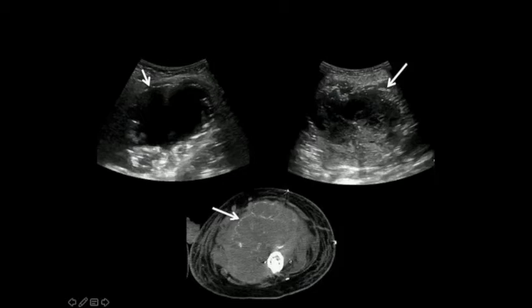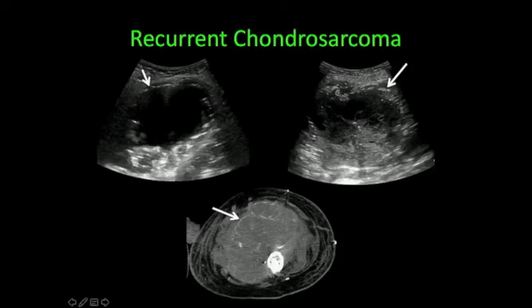So this is taking up the thigh musculature, but this was in a patient who'd had a history of a chondrosarcoma. So that was a recurrence, and that explains the calcifications. So this wasn't something that primarily came from the muscle, but was involving it, and this just gave us a clue about the type of tissue we were looking at.